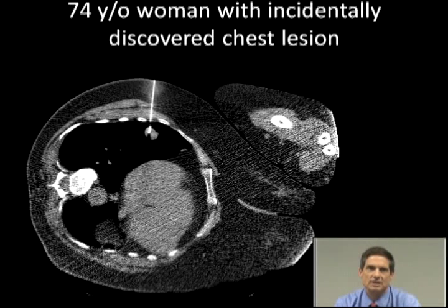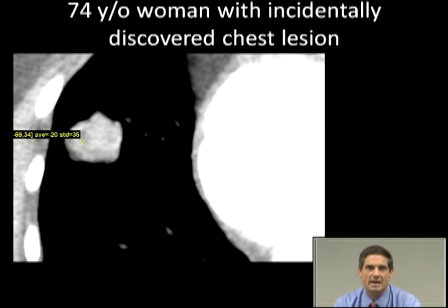There was some controversy initially about whether the biopsy specimen was adequate or not, because the pathologist said, well, I just see a large amount of cartilaginous tissue and some fat. And I went back to the CT scan, blew it up, and looked carefully in the interior of the lesion, and the interior of this lesion, which is denoted here, actually had fat within it. It's a very unusual finding for a tumor in the lung, but it is diagnostic of a hamartoma.